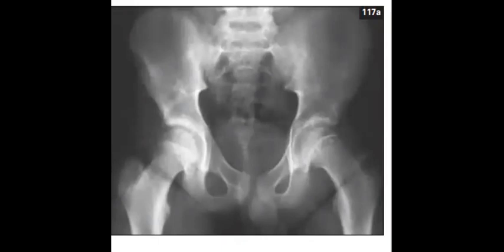You remember the line? Left slipped capital femoral epiphysis, perfect, Marwa, Justiana, it is an easy one. And you remember the line you always draw in the slip, the Klein line. So it should intersect part of the upper femoral epiphysis, yes, Doc Mansour, okay.